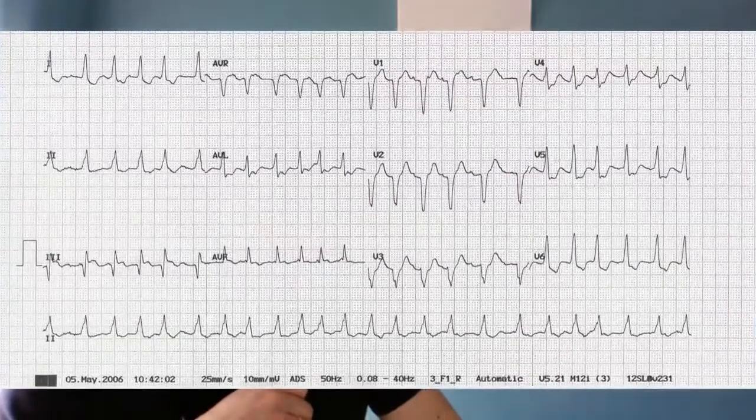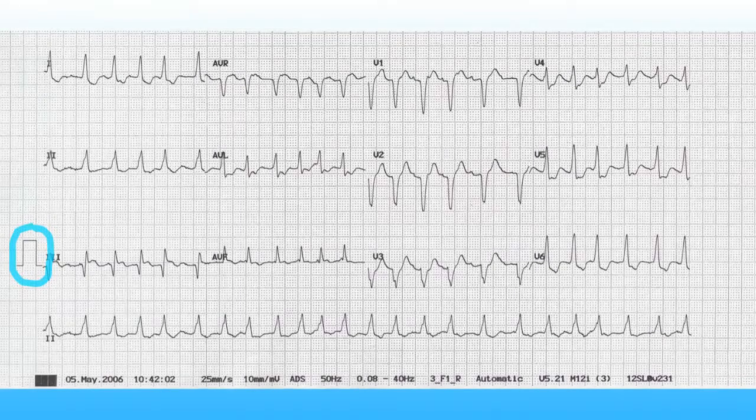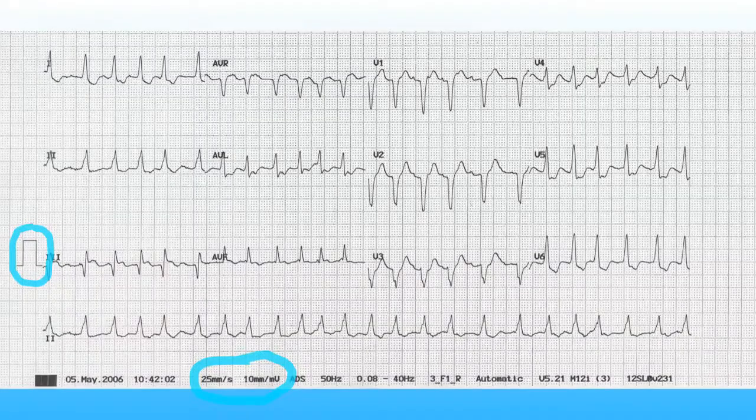So let's say that we've checked the patient details, the indication, and we're onto the type of ECG. Now, this 12-lead ECG, we want to look at a couple of things. This is obviously a 12-lead ECG, and we can notice that it's quite old, but it's here to demonstrate 2 important points. First of all, the calibration. So every ECG should have the calibration plotted on the left-hand side here. Now, to interpret that, you need to look here at the bottom of the ECG, where we can see 2 things. We can see the speed of the ECG. Here it's 25 millimeters per second, which is standard.